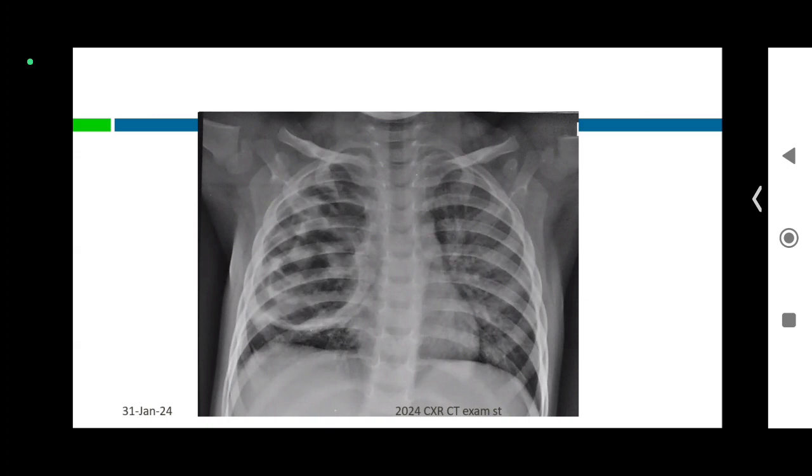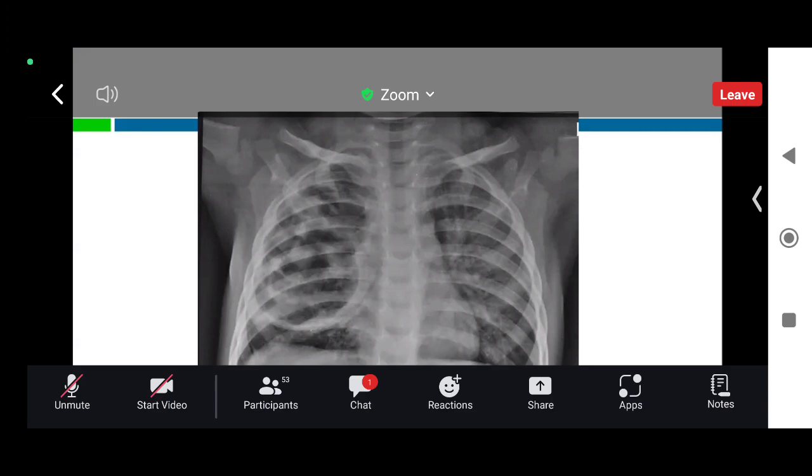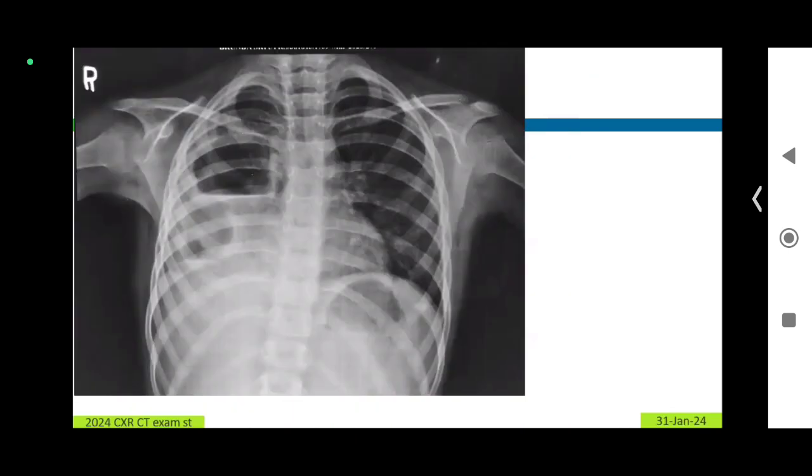Yes, pneumatocele, sir. Very good. You have multiple pneumatoceles in this child. There is no mediastinal shift, so it is still within the lung parenchyma. Necrotizing pneumonia will look like this. You'll have multiple pneumatoceles. If you want to say multiple pneumatoceles, fine, or if you want to put this as necrotizing pneumonia also, we'll be happy. Related questions: what antibiotics, how do you manage? Okay, right. What is this?